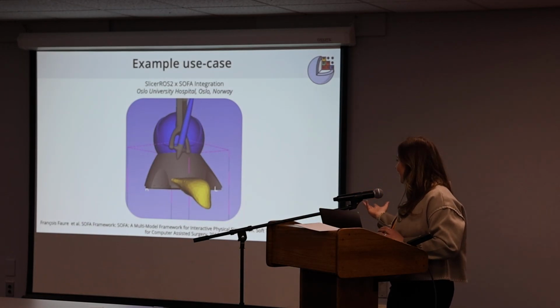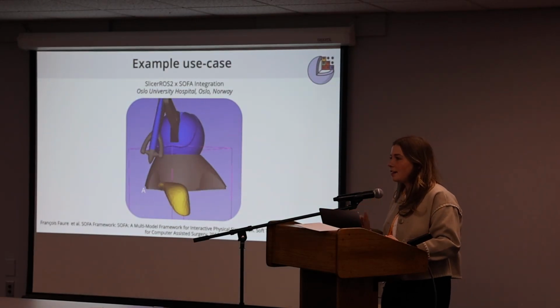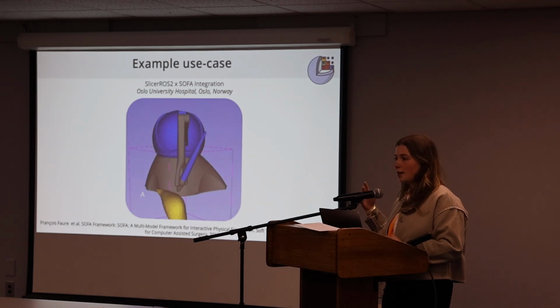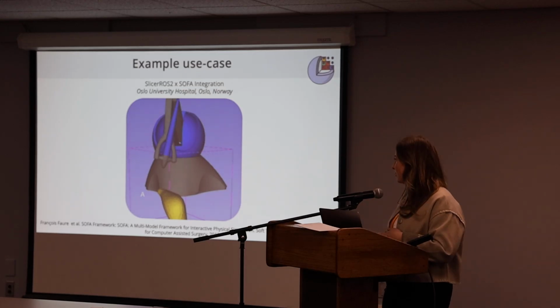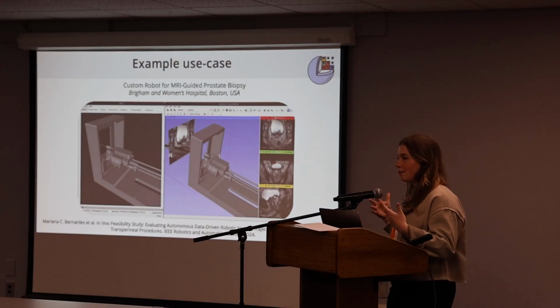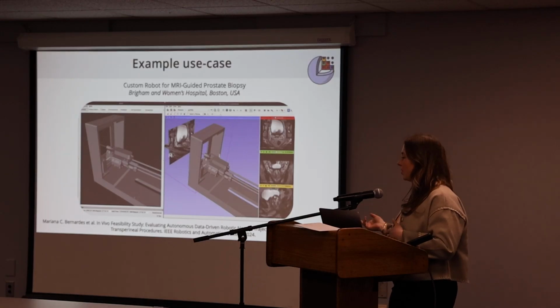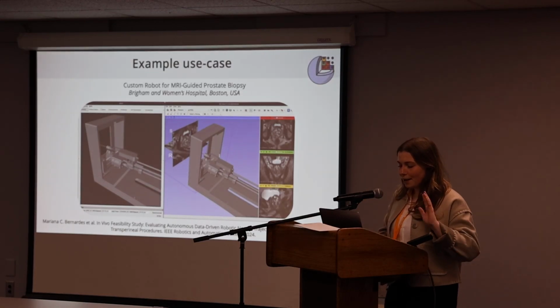And then in Slicer, we have a really active development community. I know a lot of people have been talking about simulation. This is an example of someone who's ported the SOFA simulator into Slicer. And because ROS is also ported into Slicer, you can have robots interact with these soft tissue organs. Junichi showed this morning that if you have a custom robot, you can have a custom visual interface for the surgeon to look at, where they can plan their target and then go from there. So these were all things that were enabled a few years ago.